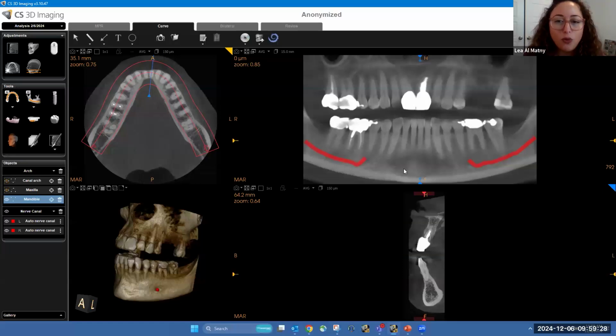And you will be able to open any scan that is saved as a native DICOM. There are a few cases where you will see proprietary DICOM, and unfortunately, in those cases, we can't use this software to open the cases. But I think it's very helpful if you are regularly looking at scans and you don't have a machine in your practice. It's good to get used to one software instead of spending 10 or 15 minutes trying to figure out how the software works before you actually get to the findings of the scan.